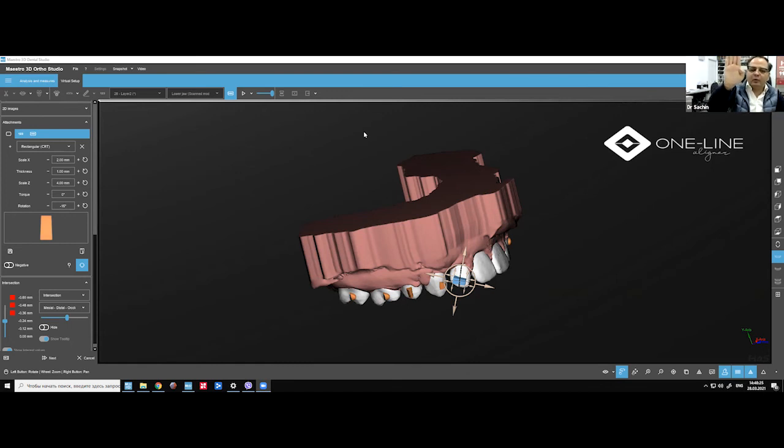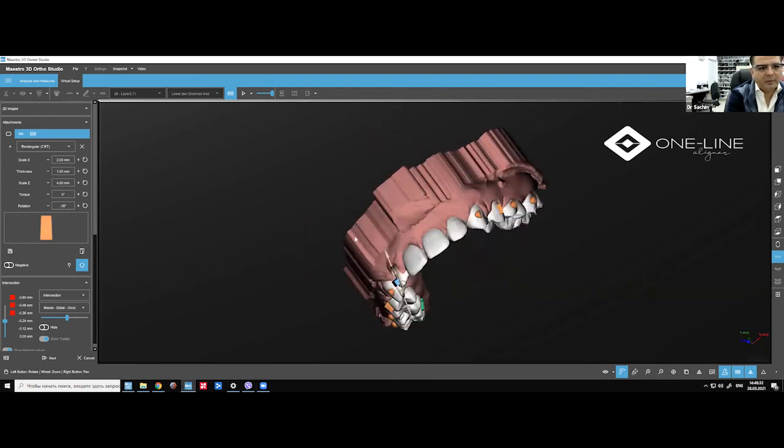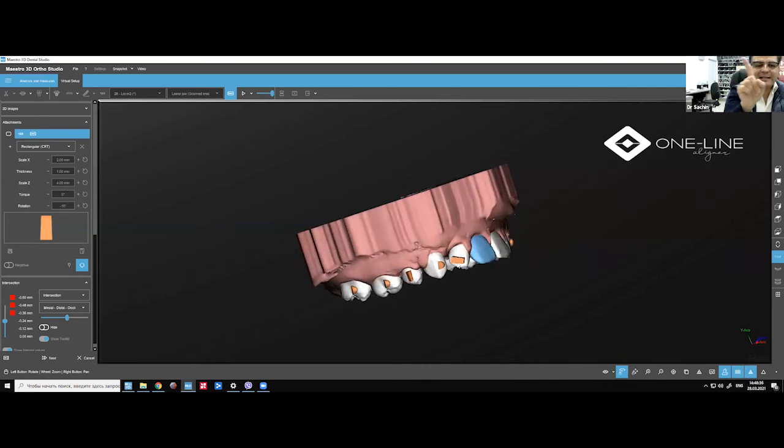But if you want to move the tooth completely, let me help you. Let's say you want to move this tooth completely, right? You want to move it distally. You are already in a very good position. Why? Because the crown is already distal. You're already pretty good. The problem is when the crown is mesial, the root is mesial. That's the problem. So for you, here, you will only plan distal crown tip or distal root tip.